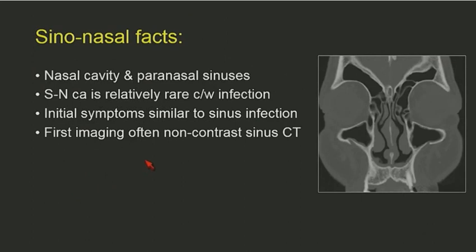One thing to remember is that as radiologists, when we're faced with a sinus CT, we often look at the maxillary sinuses, and we all love to talk about that cyst or polyp in the alveolar recess. But don't forget that the nasal cavity is part of this area. In fact, it's the sinonasal cavity or the sinonasal compartment. So we do have to look at all the sinuses, the integrity of the walls, but the nasal cavity is very, very important not to overlook.